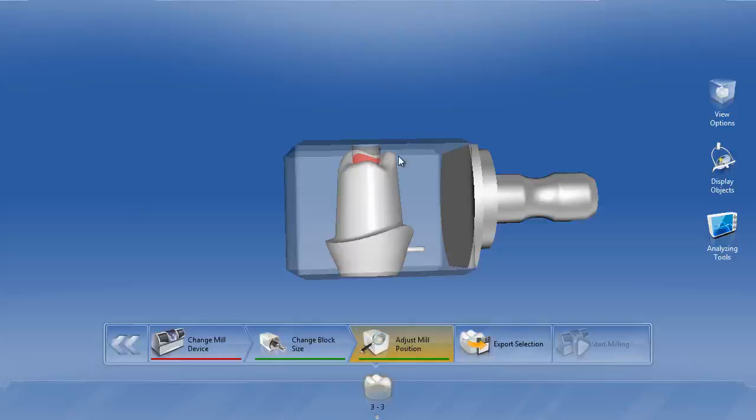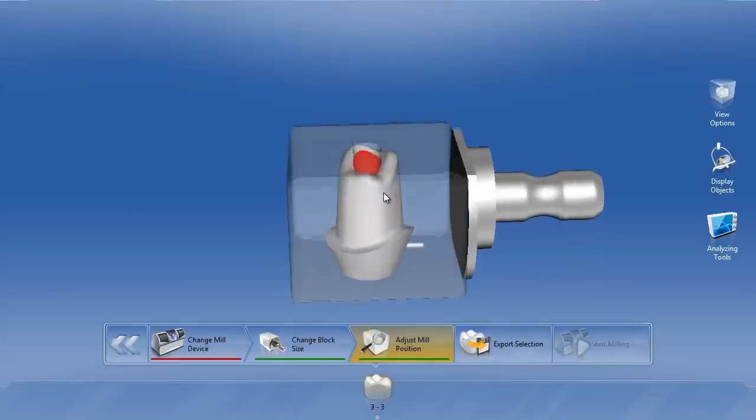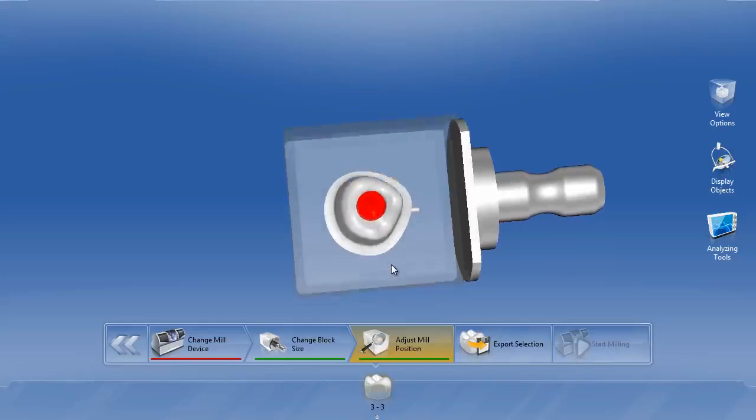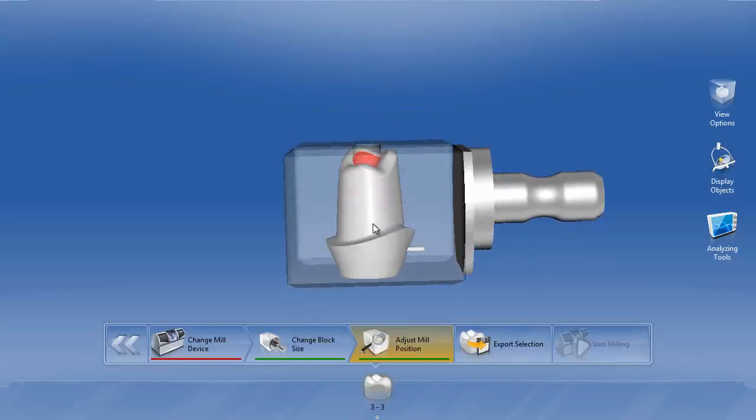So this was an implant case on tooth number 3 that was submitted by a doctor just for review. No particular problems, just wanted us to check his design to make sure it looked good. And it looks great, and I just wanted to make a video of this because it actually presents a very interesting dilemma that I haven't had a chance to discuss yet. So this is actually a perfect case.